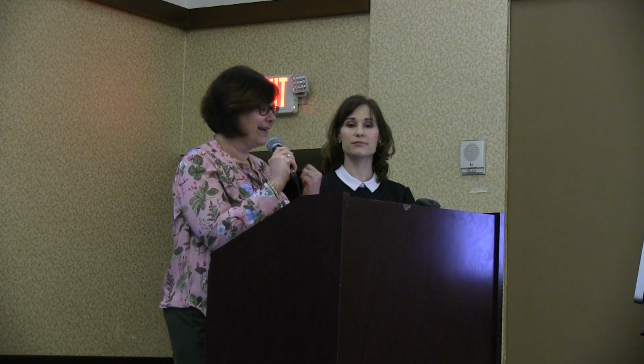I've gone out and taught a provider, set up their urodynamics for them once, and she infused everyone at 100 mLs per minute. Literally the tests were so invalid, but it's her choice. I wasn't going to say anything, so you see all kinds of things. So really just do what's asked of you.